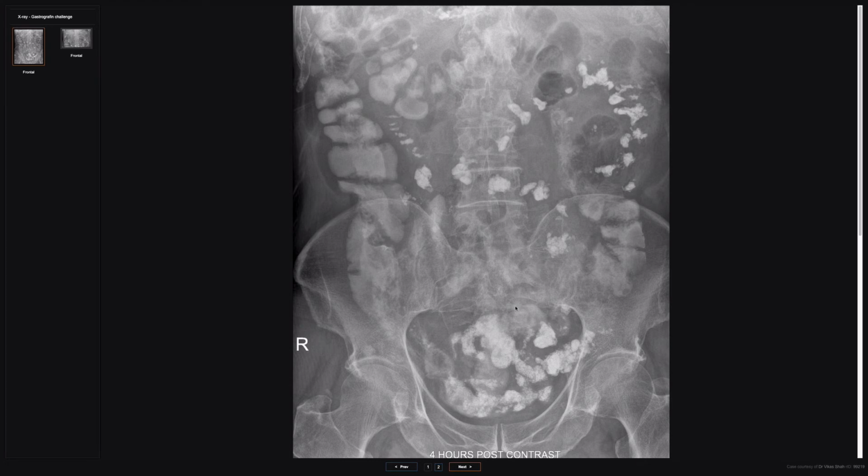So the gastrographin is administered on the ward. 100 milliliters is administered, and the timing of the radiographs varies, but roughly speaking, the first one is done at 4 to 6 hours, and then a second one, if the first one shows there is still obstruction. The second one is done at 24 hours. And that should be it. No more after that. Because if at 24 hours there are still signs of obstruction, that patient then needs to be escalated for operative therapy, not continue on a conservative management pathway.